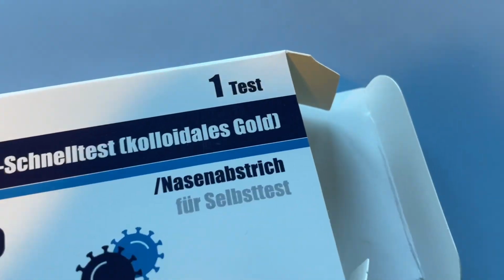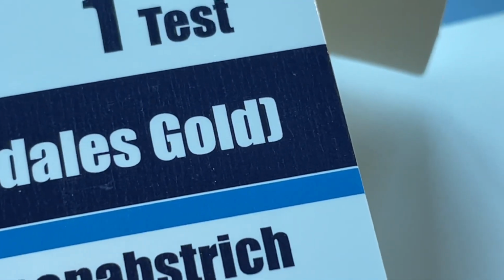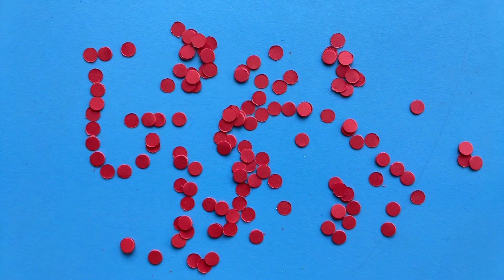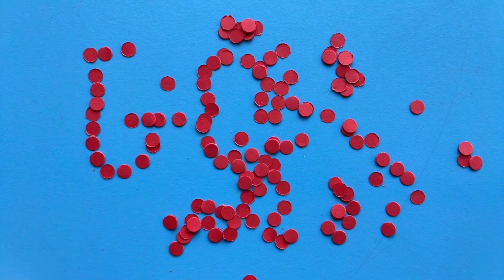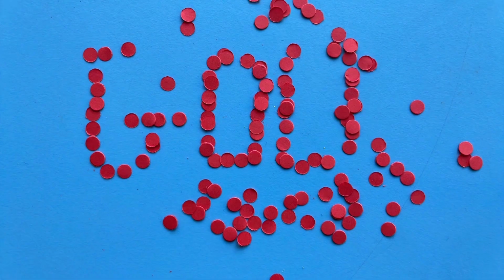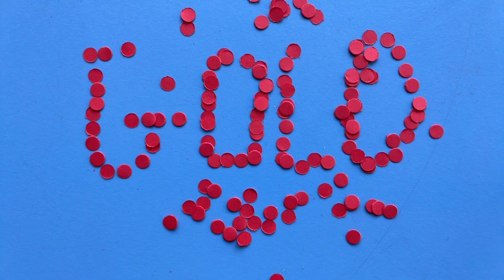That's cool and all that, but how will we actually see the antibodies that attack the antigens if they're so tiny and molecular? That's a good point. I know, let's put gold in it. Gold. When you take really small nanoparticles of gold, they're actually colored red, and you can use them to color code the proteins or the antibodies that we're going to use in our antigen test.